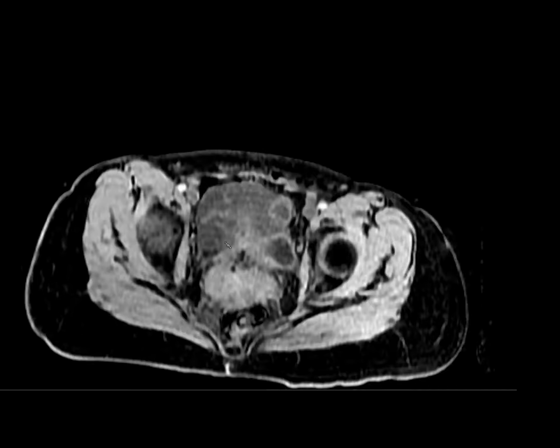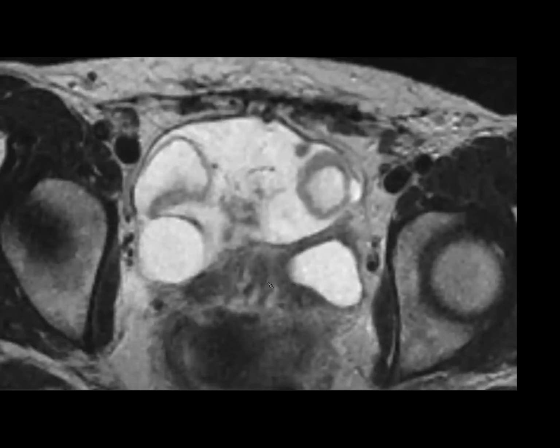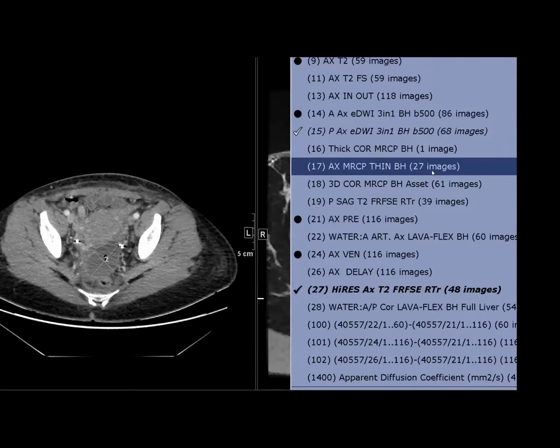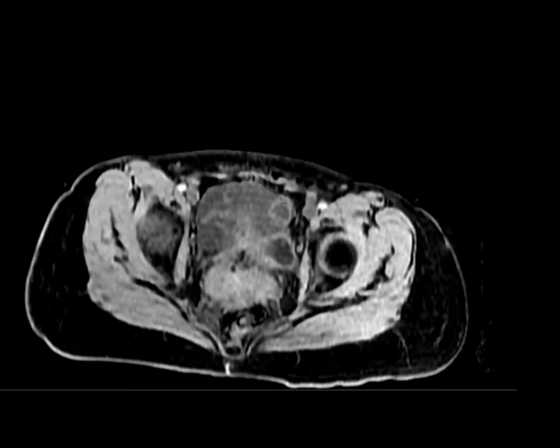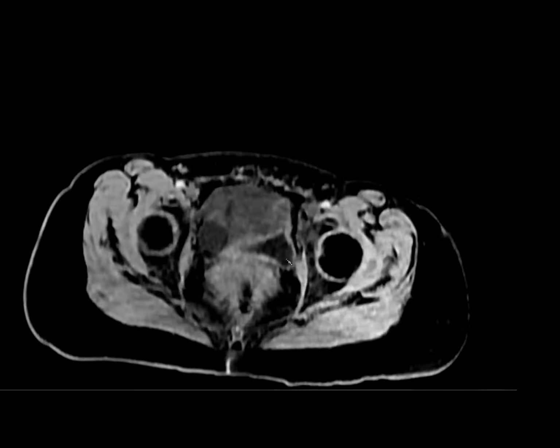Okay. Great. That's awesome. I'm glad you were here. Do you find this T1 hyperintense rim was more suggestive of hemorrhage or no? Not really. No. Show me back to T1. This was here. T1 is here. Yeah, it's a little bright, but it's still iso-intense to the bladder wall, so I don't know if that's really hyperintense.